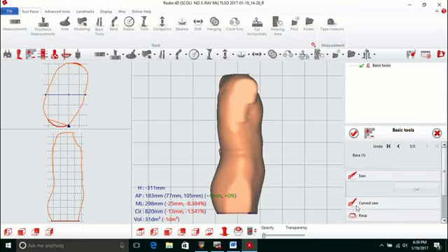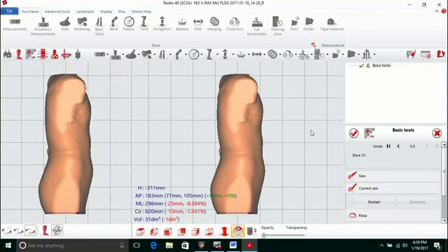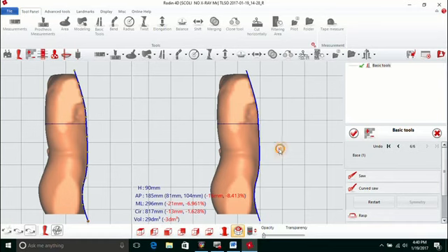Now we'll show you what the curve saw does. Curve saw, this is new in Neo, version 10.0166, I believe. When you click on curve saw, it gives you another view of your model over here in the left hand window. So if I left click, keep left clicking multiple times, I'm actually able to make a bending cutting plane. Left window is for preview, right window is the action window. So if I hold my cursor close to that blue cut line, left click on the line, it makes that cut.